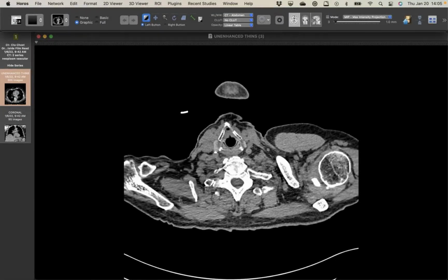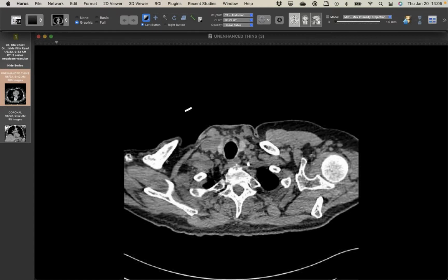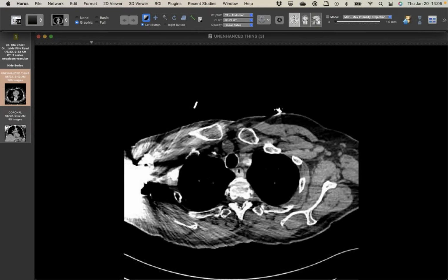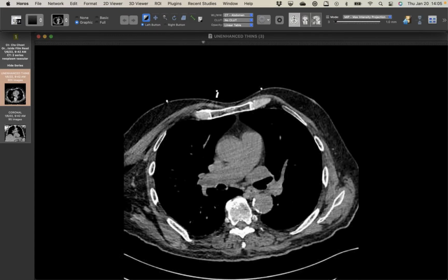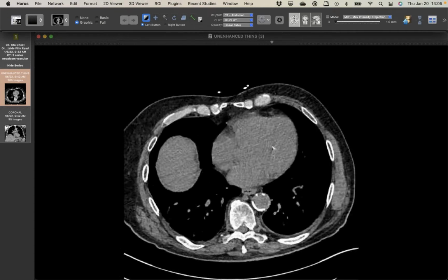Okay. So this first case was shared with me by my colleague Mark Schiebler. This is a patient who is being evaluated for treatment for hepatocellular carcinoma, and all we had was this outside chest CT. I don't have any other imaging studies, but it's biopsy-proven HCC with hepatic vein involvement. And this CT scan is a non-contrast. I'm not sure what they did on the outside.